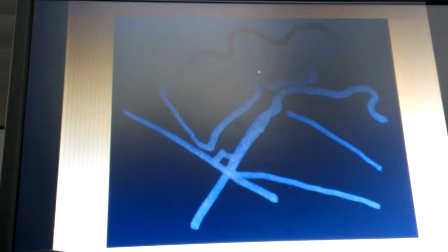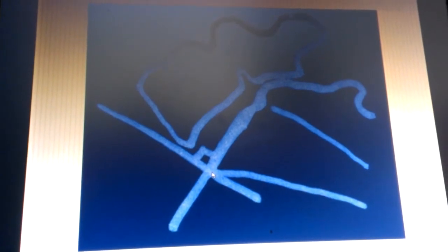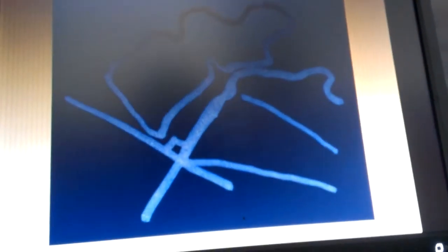Another thing to consider, though, is that instead of having the neck of a Scottish dog, it's more like, as I said before, the greyhound. So you can have some structural differences, right? I mean, that's just congenital. So that brings up an interesting point. Also, we said that the inferior end plate of, say, L5 in this case, and the sacral base should measure exactly the same. If they don't, then you've got a pseudo either anterolisthesis or retrolisthesis going on.